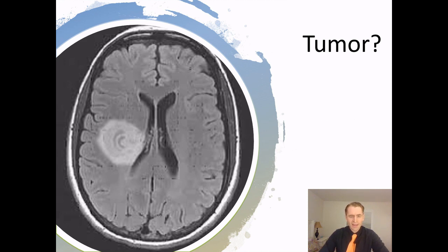Is this a tumor? Looking closely at this lesion on the left side of the brain, there is not a lot of mass effect relative to the size. Also, there appear to be some areas that are unaffected, known as onion skinning in appearance. And this type of mass tends to spread outward, but spare certain areas.